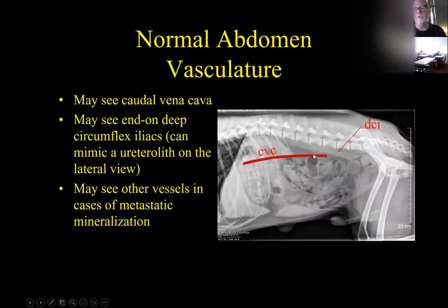Sometimes you can also see some vessels inside the abdomen, especially in fat dogs. The fat is nice because that provides extra contrast around all these soft tissue opaque organs. The caudal vena cava in a dog or a cat lives through this area here. Sometimes you'll see a fluid tubular opacity up here in the retroperitoneal space that represents where the caudal vena cava lives.